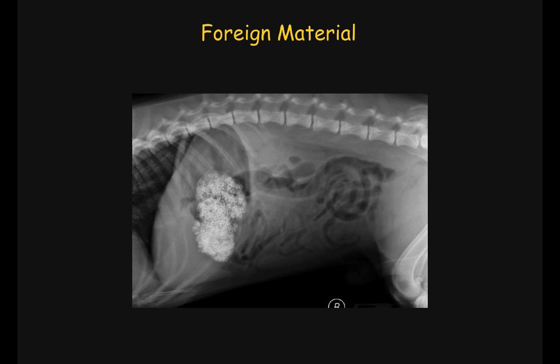Early detection of obstructive foreign material can significantly affect the outcome for the animal. Survey abdominal radiographs are useful in identifying radiopaque foreign material, and they commonly are taken to rule out mechanical obstruction in vomiting pets. In this 5-year-old vomiting dog, the foreign material is quite obvious, and we can even predict what it is.